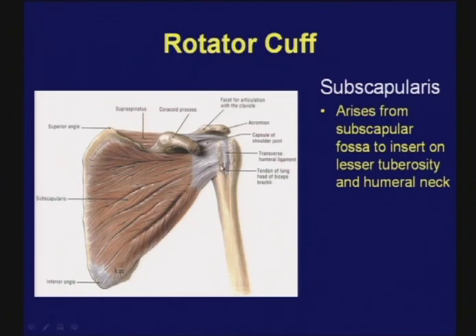So if you are not looking at the lower part, you are going to miss cases of disruption of that part, which may occur in people who have anterior glenohumeral joint dislocation. The second part of the story, often left untold, is the fact that fibers from the subscapularis are now believed to extend over and under the biceps tendon to reach the greater tuberosity. So some of them do not end at the lesser tuberosity, they extend to the greater tuberosity.